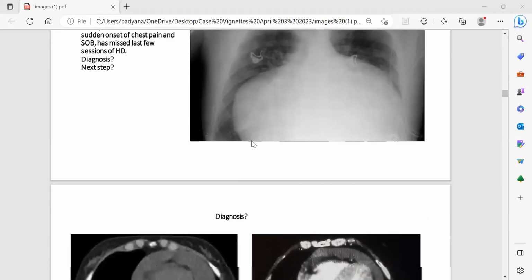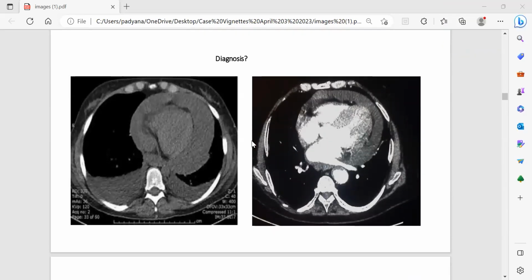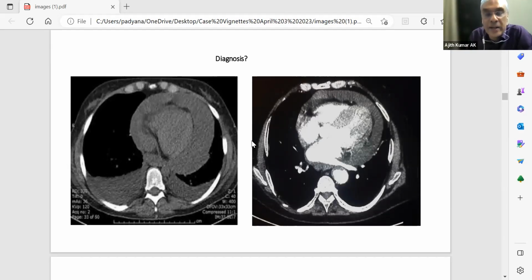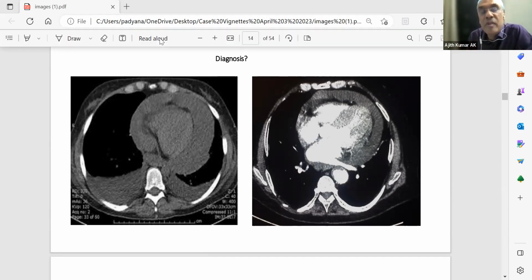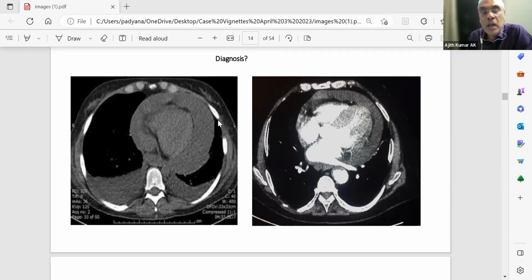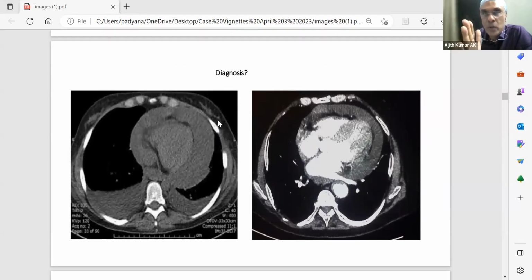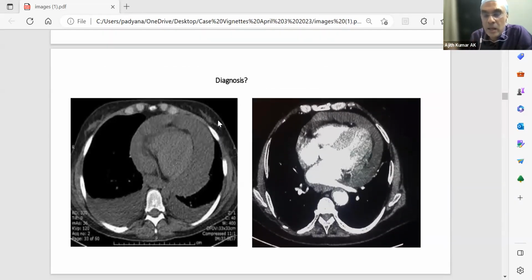Yeah, go ahead. Next one. So more than 50% of the hemithorax. That's it. It's a pericardial effusion. This is 50% in adults. In children, the heart will be a little bit high, so it should be more than 55%. Adult it is 50%. 60%, my apology. So more than 50%, you see the largest from the mid vertebral point. You see on both sides, whichever is the largest distance on whichever side of the heart you take, and you add. More than 50% in adults is cardiomegaly, more than 55% in children, if I'm not mistaken.